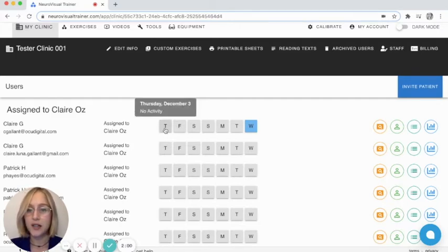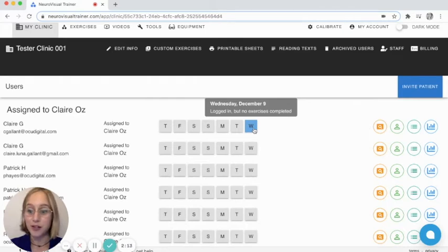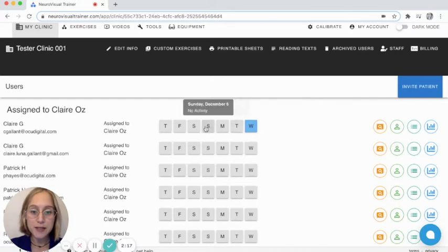And over here, you have the days of the week. So the last 7 days, you get to see, have they logged in? Have they performed some activities? So here you can see that with this test patient, we've logged in but not completed any exercises on this particular account. But here is also where you could see some reporting.